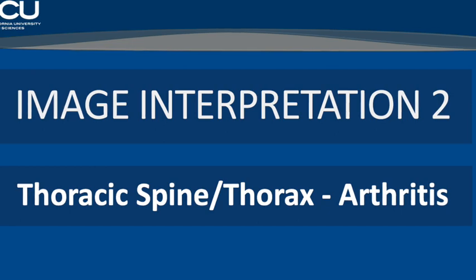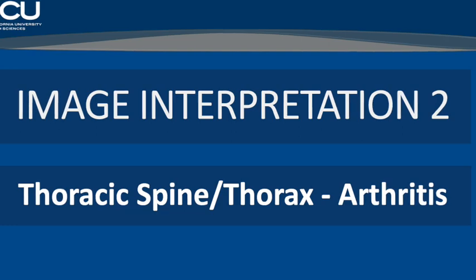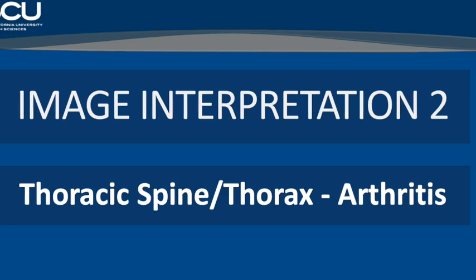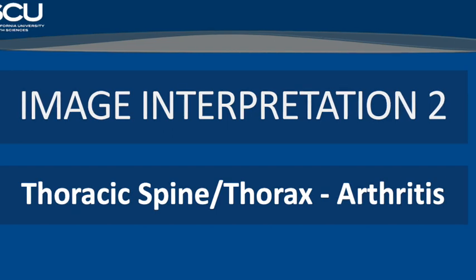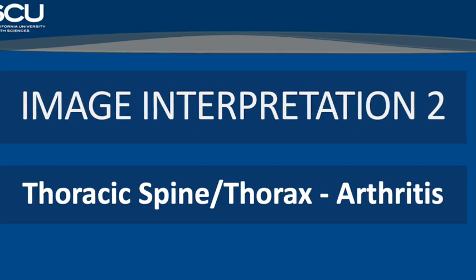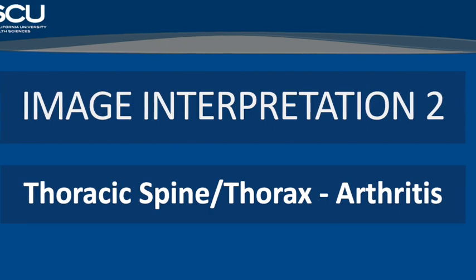From a radiologic standpoint, we can see several key findings with dermatomyositis. Early on, there is soft tissue inflammation with increased thickness, increased density, and blurring of the normal fascial planes around the muscles. As the disease progresses, sheet-like soft tissue calcifications may develop within the inflamed muscles. In later stages, we can see soft tissue atrophy from chronic muscle injury. Steroid treatment puts these patients at risk for complications like osteopenia and even osteonecrosis. Around the joints, we may appreciate periarticular osteopenia, swelling, but typically no erosions given the non-erosive nature of the arthritis.